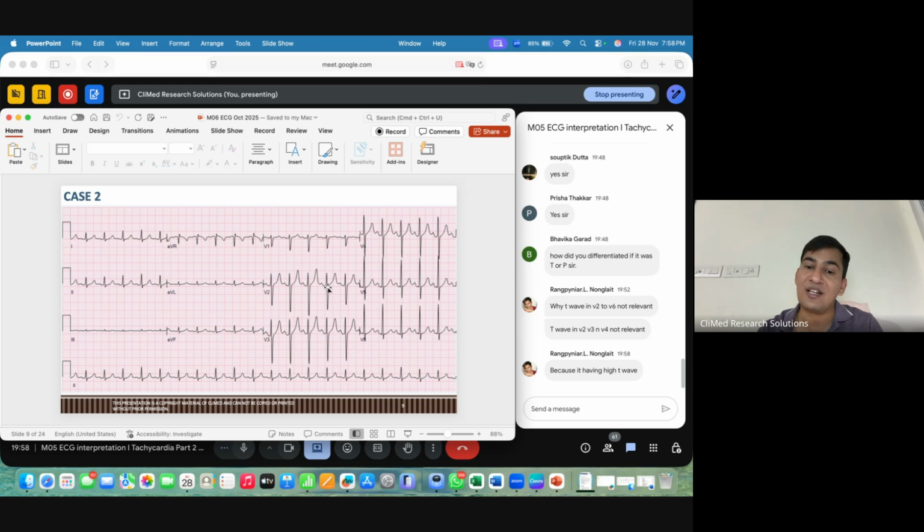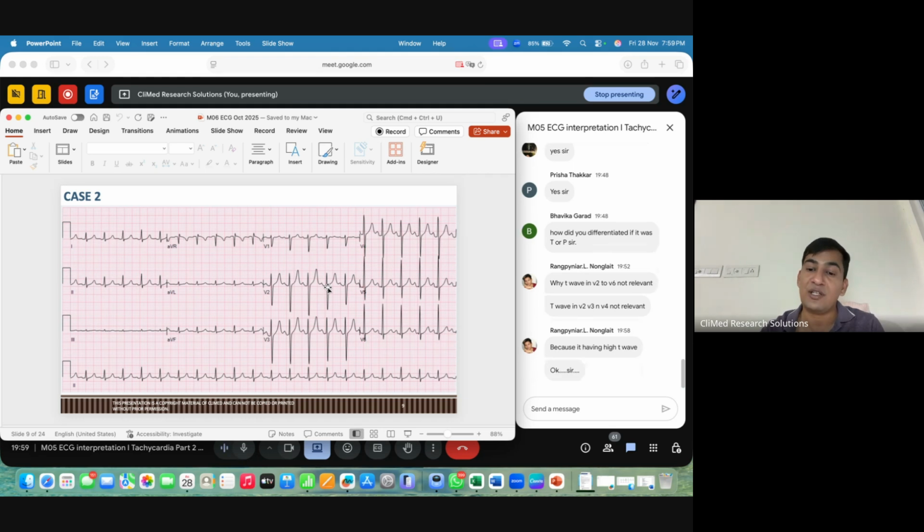And those voltages are fluctuating because the person has come just after exercising, right? So in the body, the overload and the oxygen supply and a lot of things can lead to this. The voltages are fluctuating here, right? There is no inconsistency, there is no irrelevancy, everything is similar. The pattern is similar, just the voltage is the problem here.